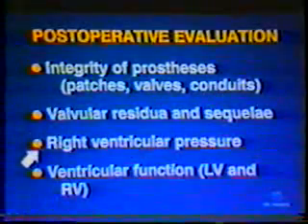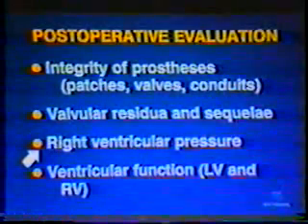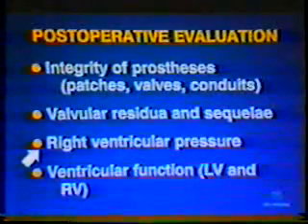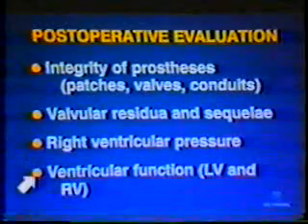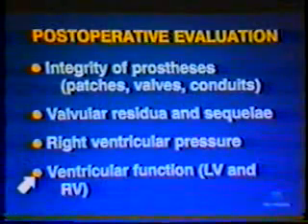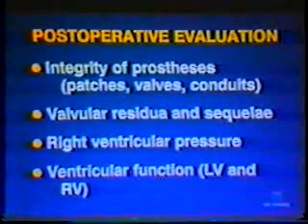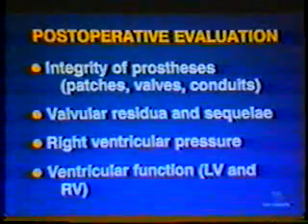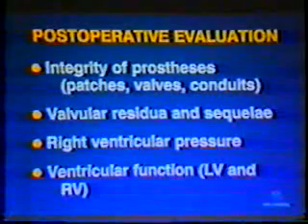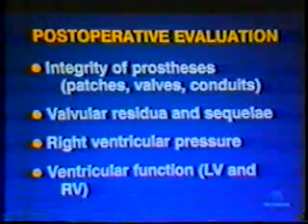Right ventricular systolic performance, including determination of right ventricular pressure, is paramount in the post-op evaluation. And many cyanotic conditions produced left and right ventricular dysfunction. So in the systematic post-operative evaluation approach, we must evaluate the left as well as right ventricular systolic as well as diastolic function. Now we will demonstrate examples of select post-op lesions illustrating residua or sequelae of the operation.